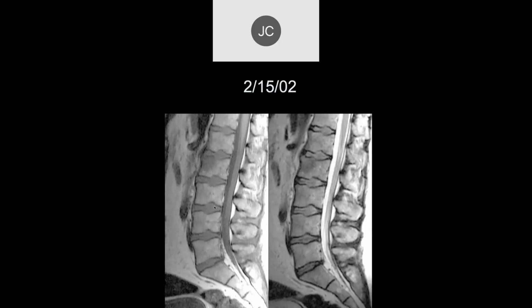Looks like there's hypointense signal on both the T1 and T2 images of the L2 vertebra, the anterior superior aspect. Let's go look at this. Disc spaces and plates look pretty normal throughout, similar at each level, so I don't think there's any extension into the disc at all.